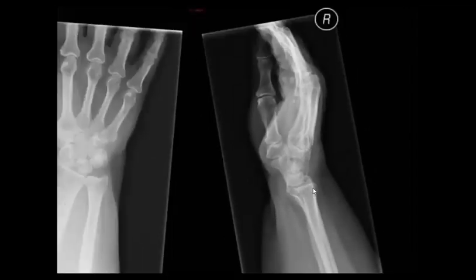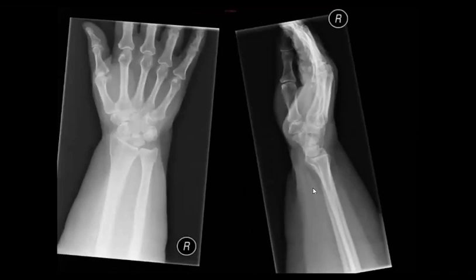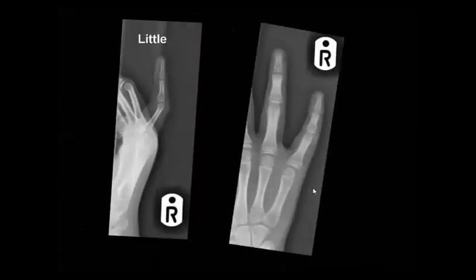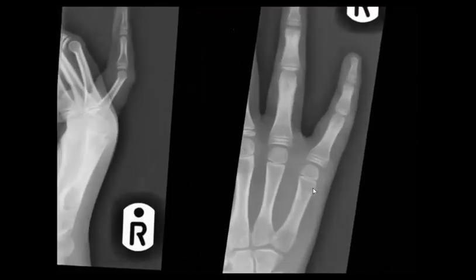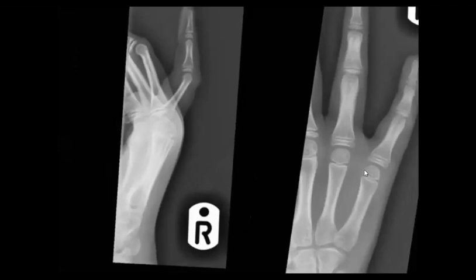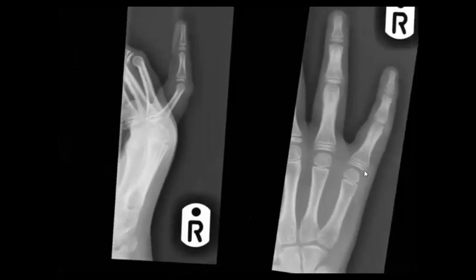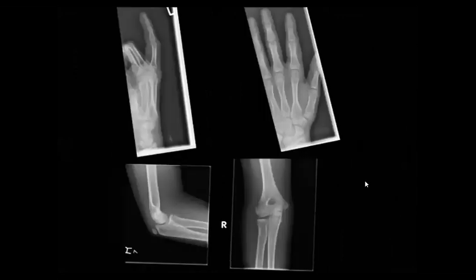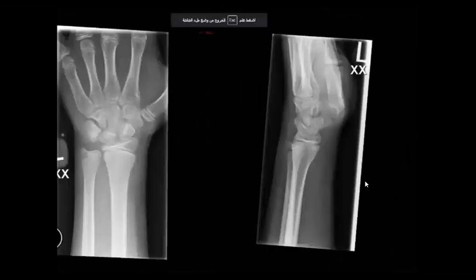Yes, triquetral. Okay, I see that you are tired, so maybe just one or two more cases and I will finish. Maybe this one we can skip because it's a bit hard.